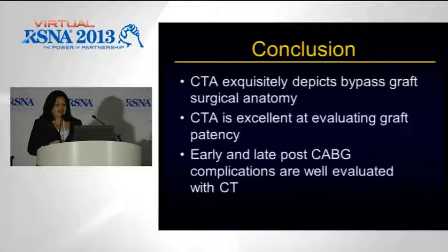They want us to look at the grafts on CT, and even if the patient's heart rate is difficult to control, we can see grafts reasonably well. I had one such patient who had 4 bypass grafts, all of them occluded within 3 days. So we can help in making the diagnosis and in the further management of these patients.